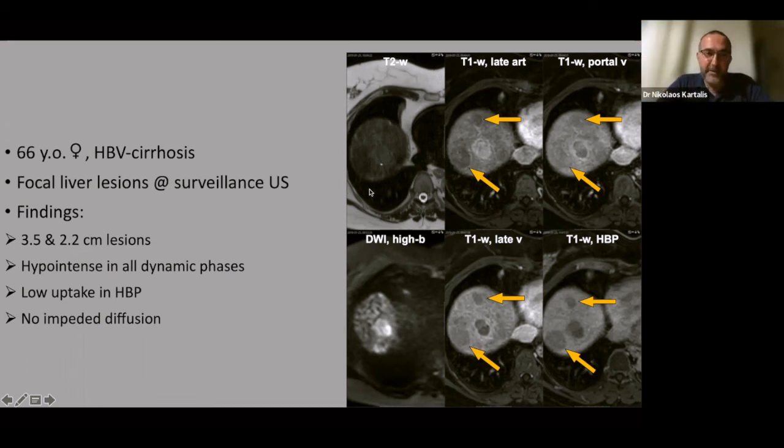I like this number a lot. However, this is something that we need to discuss. So the majority, 92%, say benign. And actually, if you follow the guidelines, you end up thinking that these are benign lesions because these do not fulfill the criteria of HCC, the imaging hallmarks of HCC, as they are easily called. But let's see. I will take you through the images.